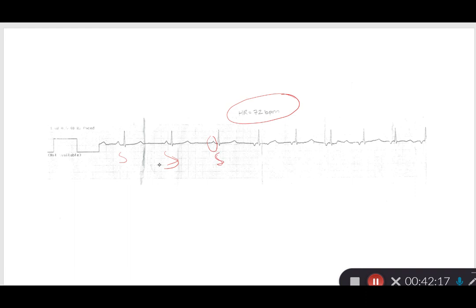It is still sinus. It's coming from the atria. But now my pacemaker site is moving. It's moving from the SA node to here. I go into a junctional rhythm, into the AV node. You can see I continue to be junctional from here on out. So there's two different ways to label this. One way, you could be very specific, and you can say this is a sinus rhythm transitioning into a junctional rhythm. Or you can call this a wandering pacemaker, because our pacemaker site is moving from the SA node down to the AV node.